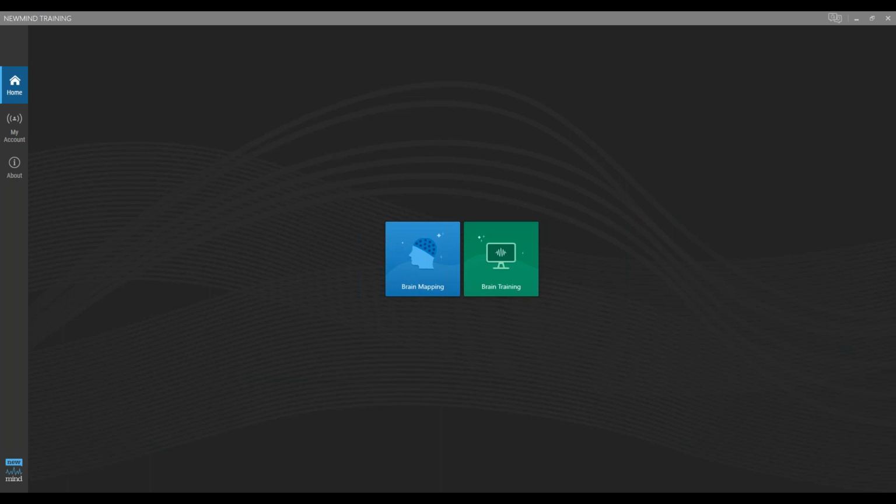And that one's a little bit harder to figure out because sometimes we might be doing, let's say, a 14 hertz on the left and an 18 on the right. So what you would see in your raw data line, if you're picking up interference from the glasses cable, would be that frequency band. You would see either a consistent 14 hertz or a consistent 18 hertz signal.